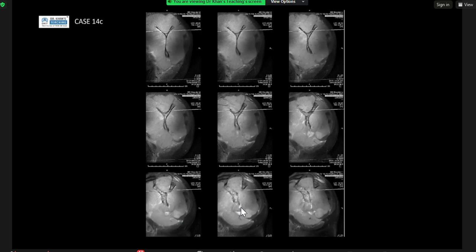So this is the second most common primary bone malignancy in children after an osteosarcoma, and it has caused cortical destruction, and I see some pooling of contrast within. The lesion is quite big and involving multiple muscles around. My differential would be again an Ewing's sarcoma.